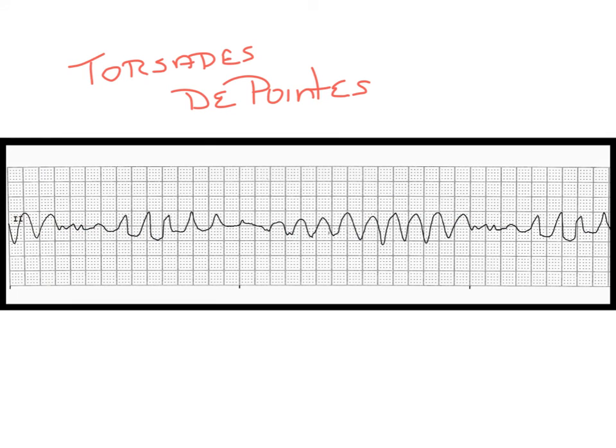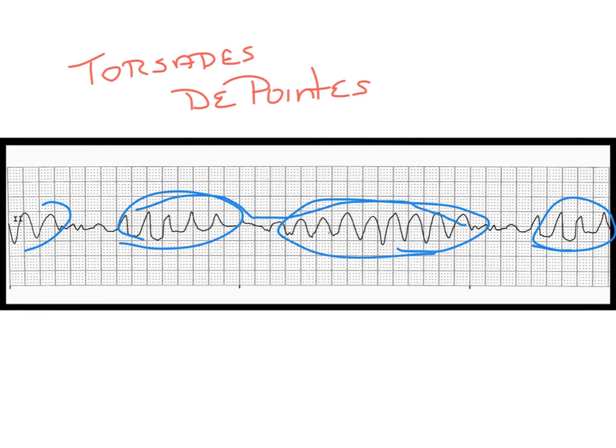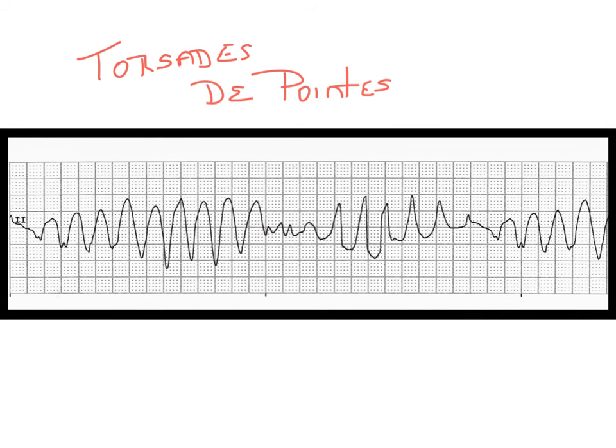Another torsades. Remember, this looks a lot like this. If you go back, this will look a lot like this back over in here. So, and again, you have that distinguishing up, down, up and down concept. So that's the torsades de pointes. It has a lot to do with the electrolyte imbalance in the heart, usually potassium and magnesium issues. So we have ways to treat this. Figure I'd give you another one.